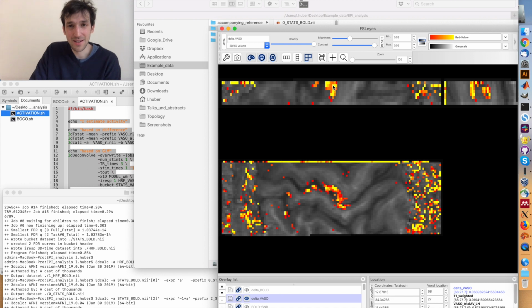Also maybe here in this would be an axial-like view, you can see these double stripe patterns right there. So those are the features that we're interested in and also want to look at in the layer domain later. So let's do that.